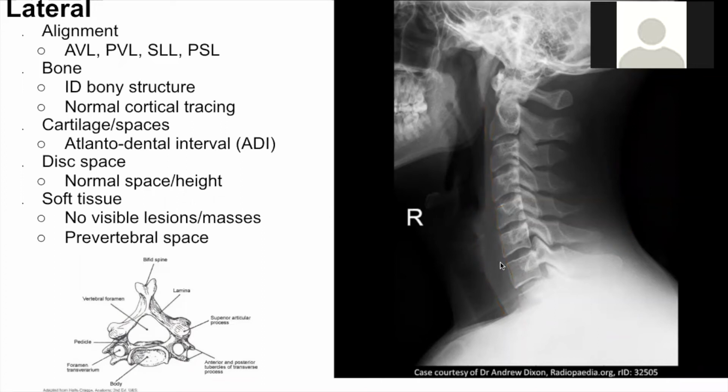So you would see this space here be just as thick. So it'll kind of go all the way up. So this would be gray as well, right? So that's why we even care about this retropharyngeal space or prevertebral tissue. And that's basically it for the lateral X-ray.